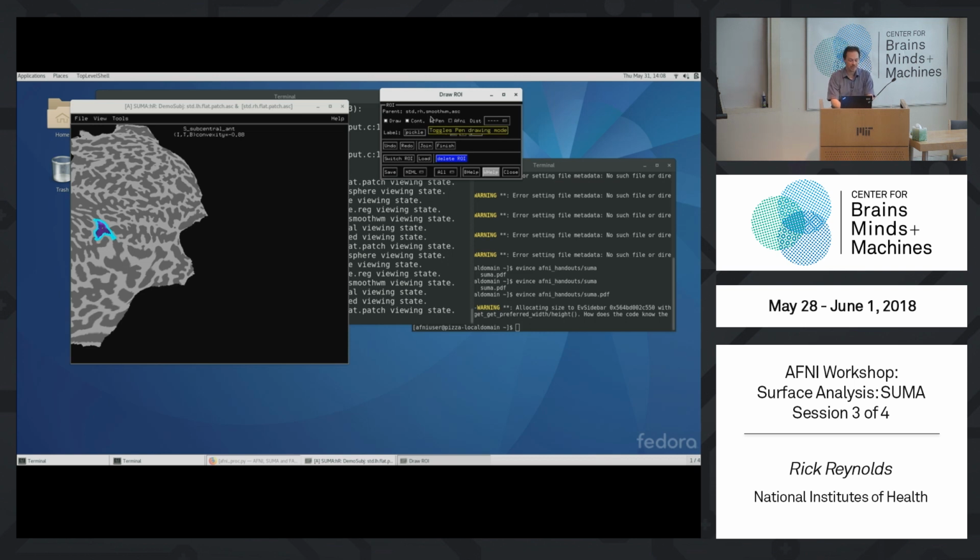It's another drawing step, just by clicking inside. And now you've got a different color in there, again a visualization to show you what's happened. Now I can hit finish. That last finish step, one more color change, and I know I have a complete connected 2D set.